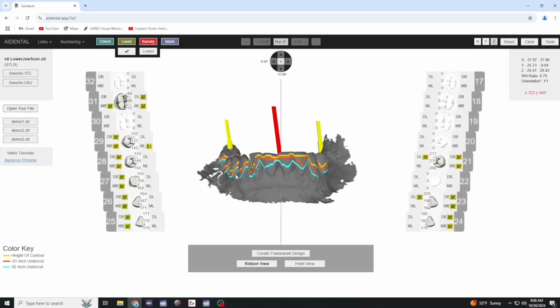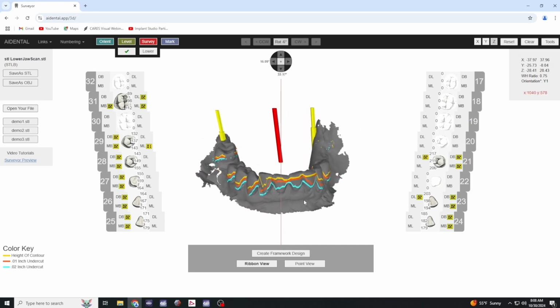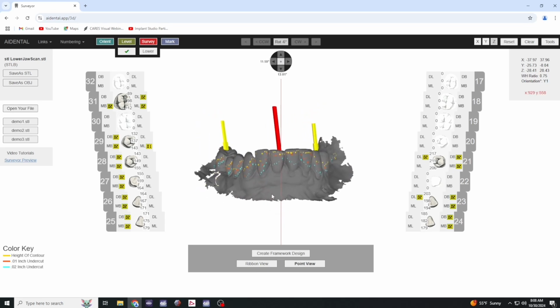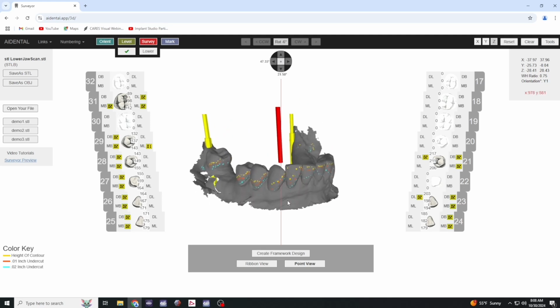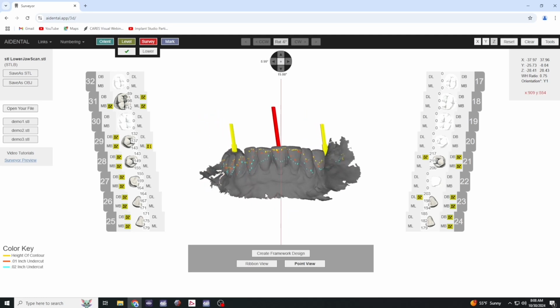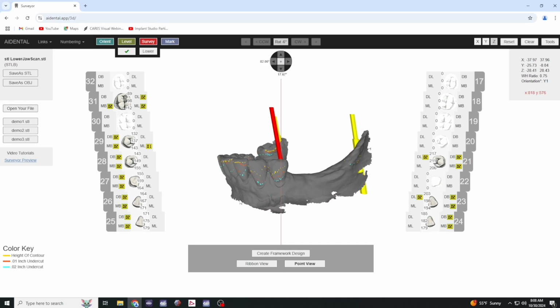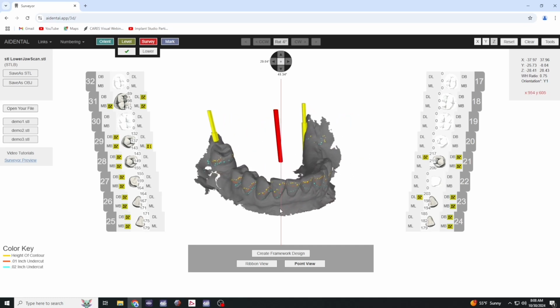To get a more accurate view of where each undercut exists on the surface of the teeth, I recommend using the point view, which gives you a more accurate view of where each single undercut exists on the surface of the teeth. The software will automatically try to detect which teeth are missing and which teeth exist. However, unusual size or shape of the teeth might result in them not being detected, and in that case, we'll need to add them back.